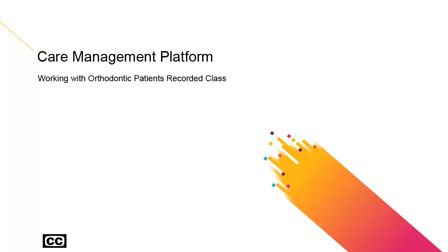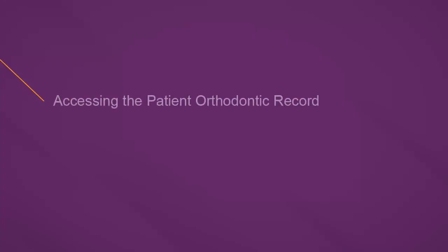Care Management Platform working with orthodontic patients. Accessing the patient orthodontic record.